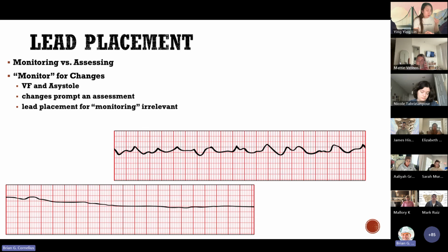So this is one of the big things. For a long time, we were taught to look at things in more than one lead every time. For instance, in ACLS, if we thought something was asystole, as a safety mechanism, they would have us confirm it in a second lead, because it may be a lead that's fallen off or it may just be providing a very poor perspective for that patient. So you have to think about, am I truly seeing the best image for that patient? And if not, if I'm going to make a pretty significant clinical decision, let me take a look at another lead.